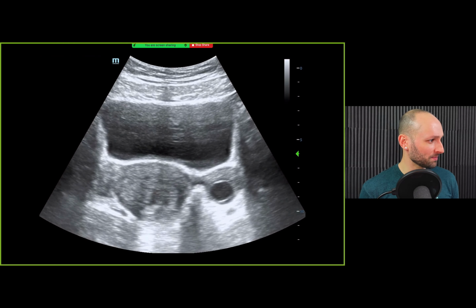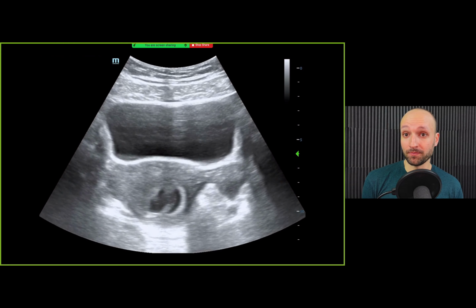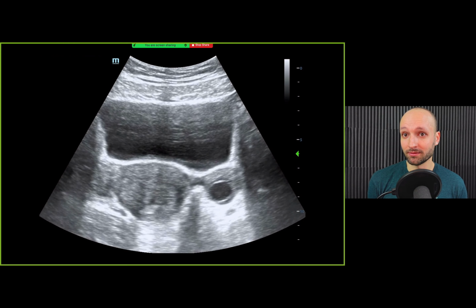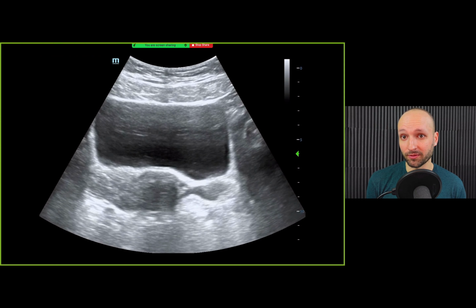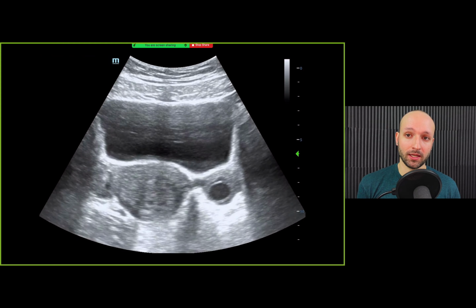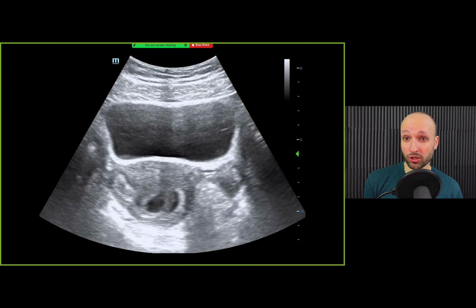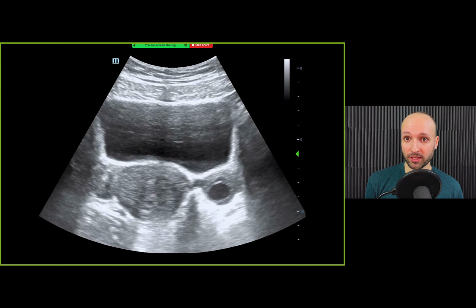Josiah asked, any tips on seeing ovaries on transabdominal ultrasound? I can never see them. You and most everybody else, Josiah, it's very difficult to see the ovaries. I will tell you that for me, the two big things are the bladder being full, that helps a lot. Often a little bit of pressure helps too, like just pushing a little bit harder on the transducer.